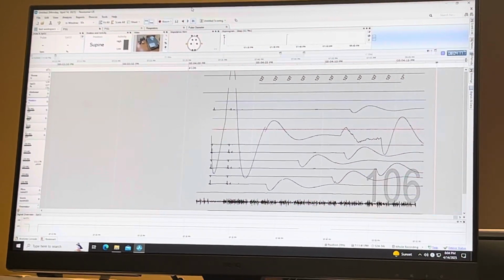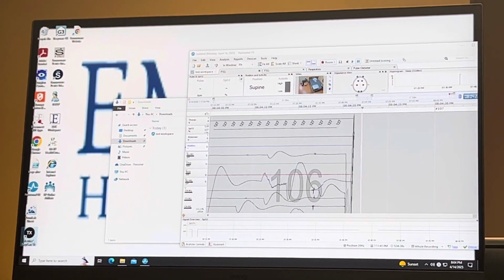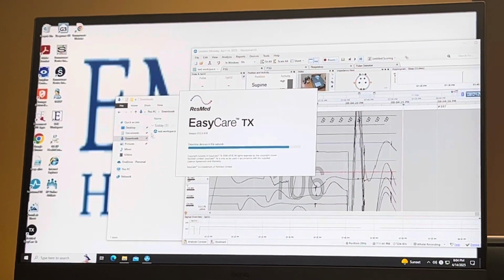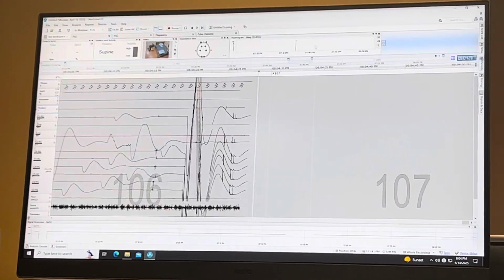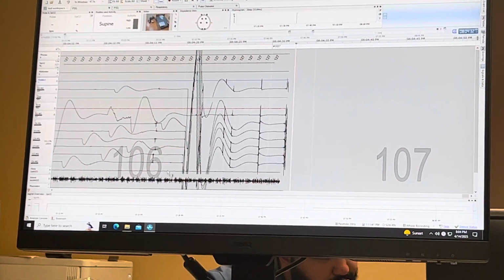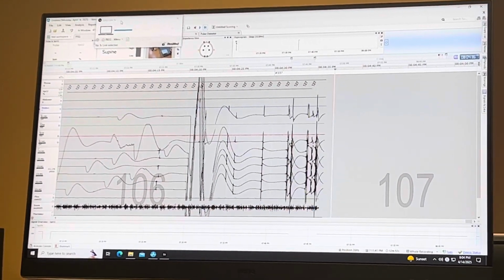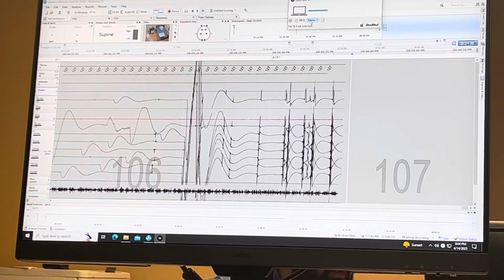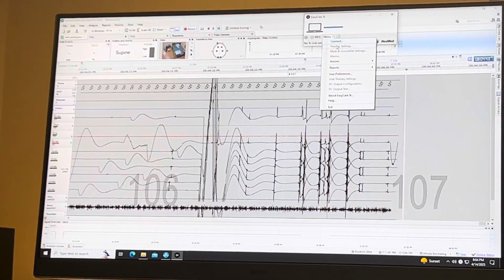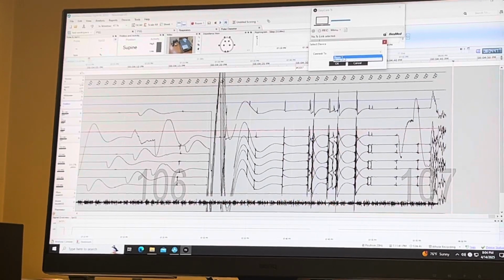So on the computer, we can minimize Knox. And then you gotta go over there and open up Finder Easy Care. This is the older version, so you don't have to log into it. So once that pops up, it should just connect. Cause usually when I'm having a split, I'm gonna have that open anyway. You should already have it open. I'm gonna have that open, cause I troubleshoot that menu too. Sometimes you have to open that up. Connect, and we're in room 1.